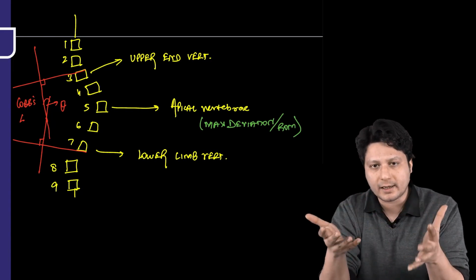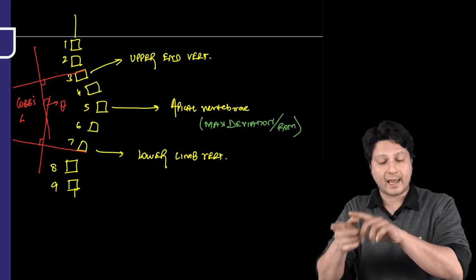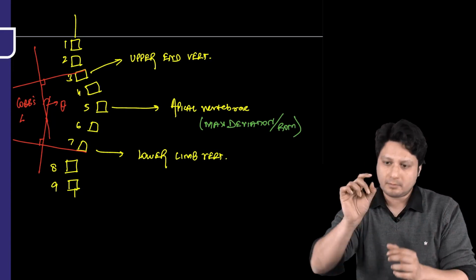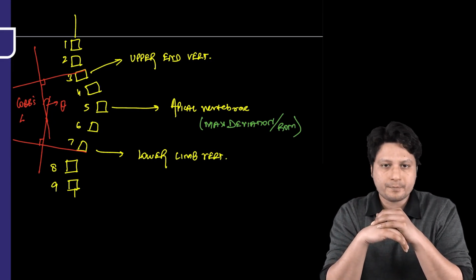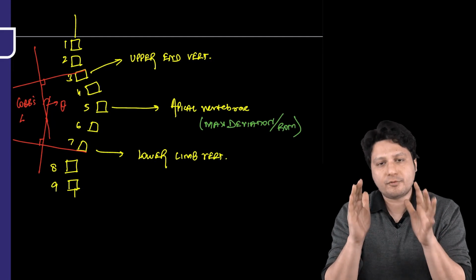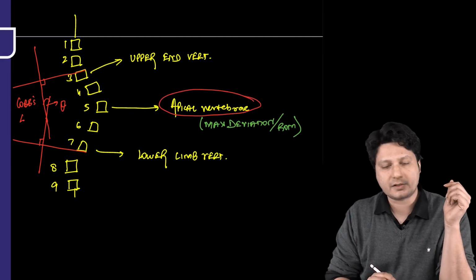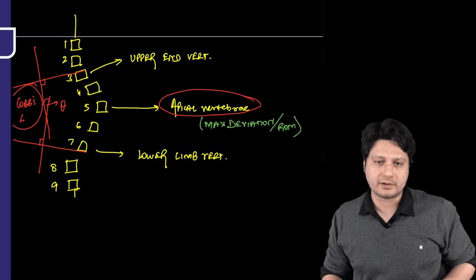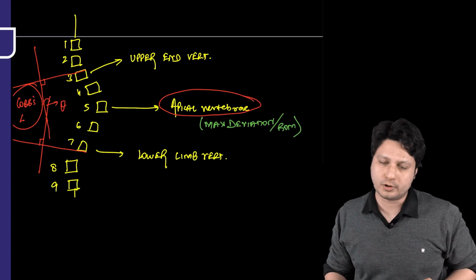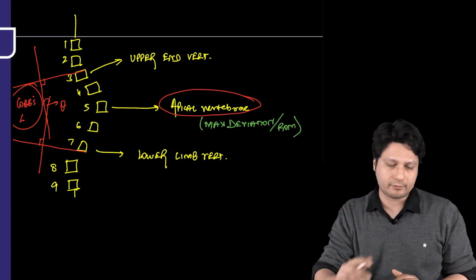For that, what you have to identify first is the scoliotic abnormality. Second, how the angle was constructed. And third, in the answers, you have to mark that as a Cobb angle. All right. Now, each and everything, that means the apical vertebrae, has a significance. The Cobb angle variations have a significance in the management of the scoliotic abnormality. So this is one important X-ray finding that you have to remember.